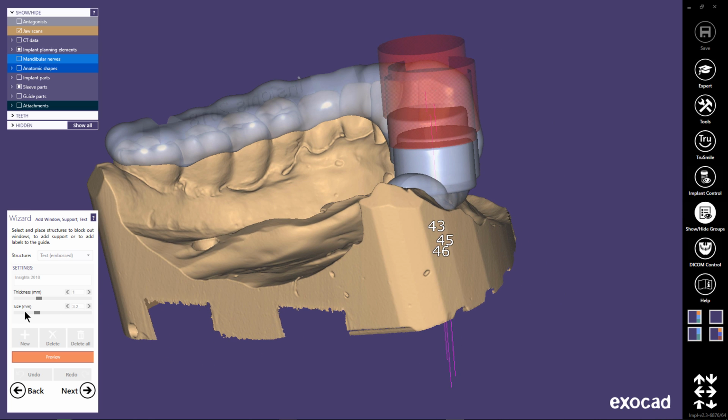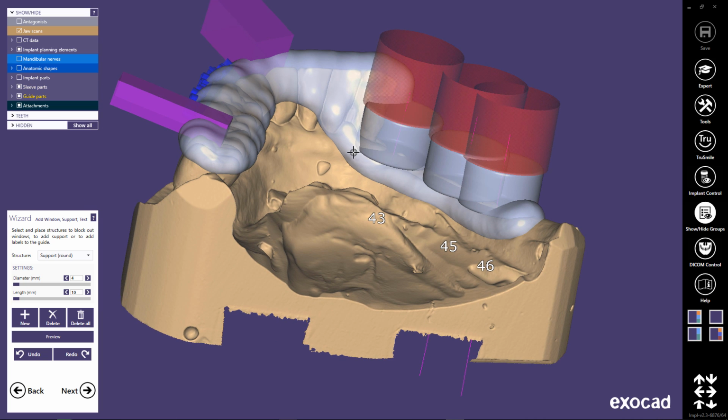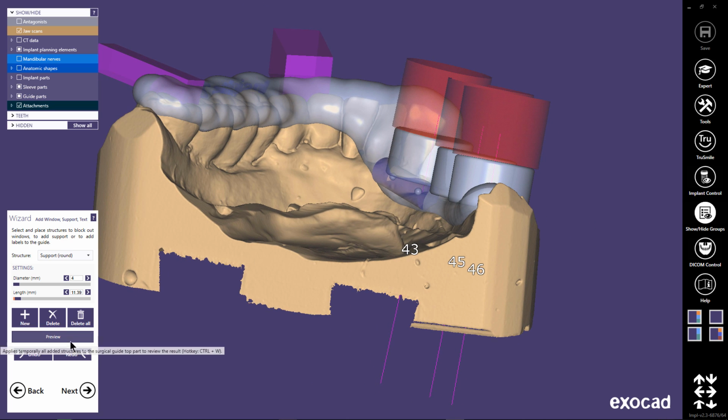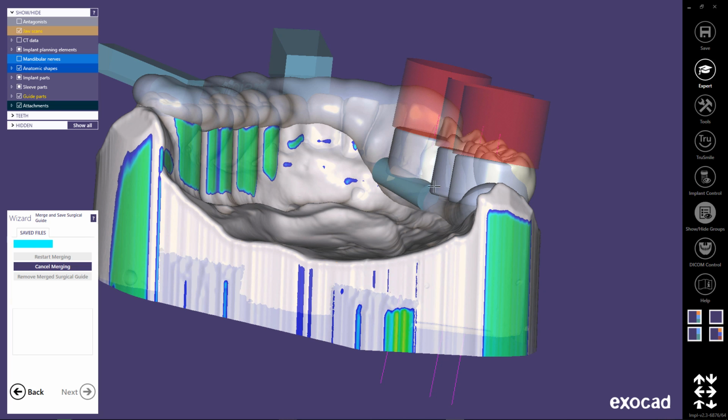I was thinking of adding a little bit of material over here. I want a round one. So like that.